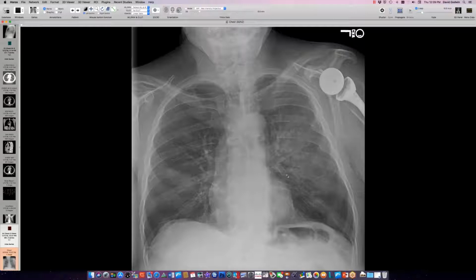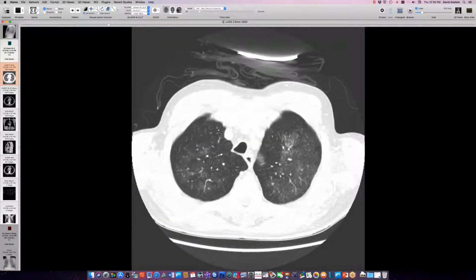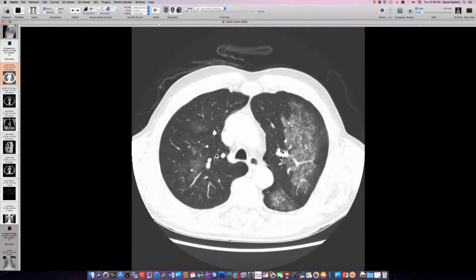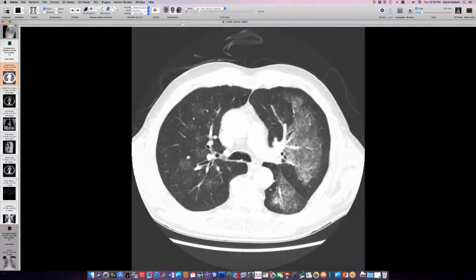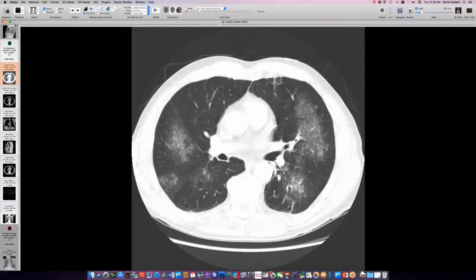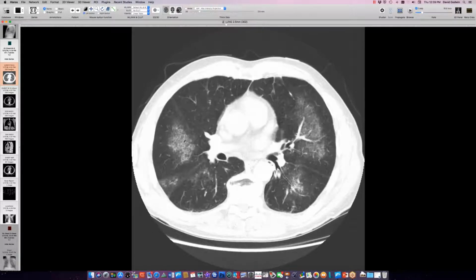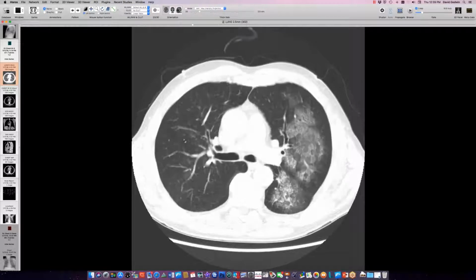At the time he was having hemoptysis, so he got this patch on the left and a smaller patch here on the right. On CT, we have this ground glass abnormality. It's got some sharp margination over part of its boundary, but not all. It's got a little reticulation superimposed, so a nice crazy paving pattern. And this was a pulmonary hemorrhage. And so there was a whole lot of serology done. All of his ANCA studies were negative, things like that.